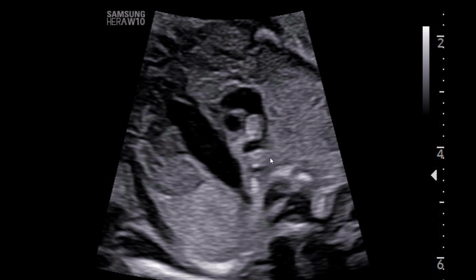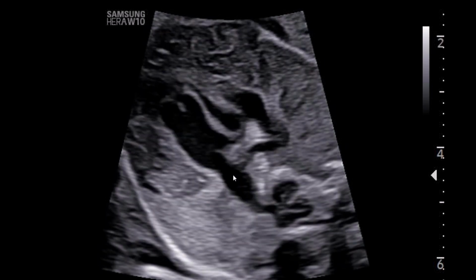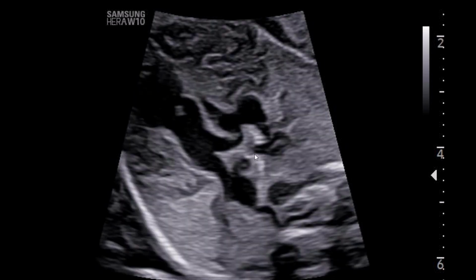The difference between the three-vessel tracheal view and the three-vessel view is that you have the pulmonary artery bifurcation, and you don't quite have the trachea. You have bronchi at this level. And so you have the three-vessel view where the SVC, the ascending aorta, and then the pulmonary artery, and you have the pulmonary artery bifurcation here, and you do not see the ductus arteriosus.